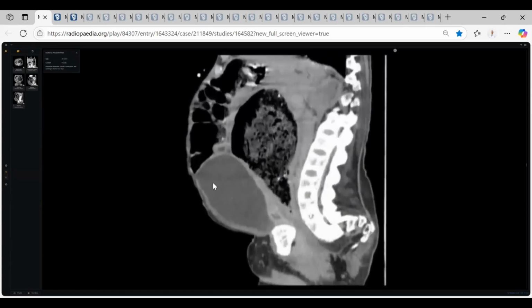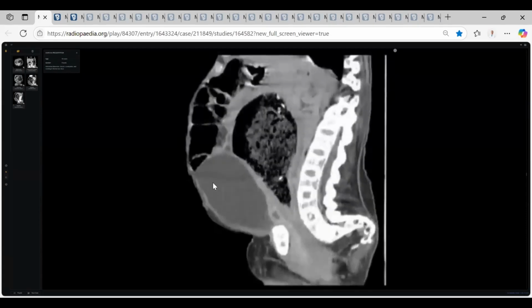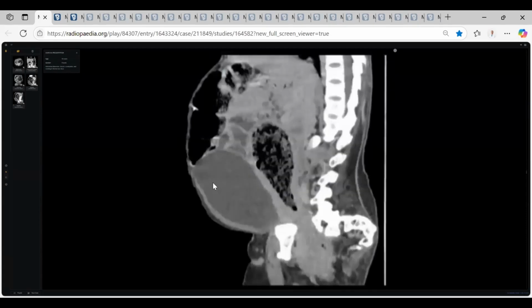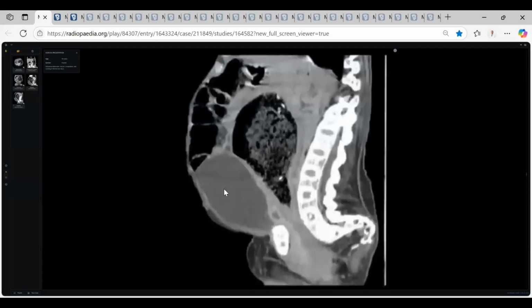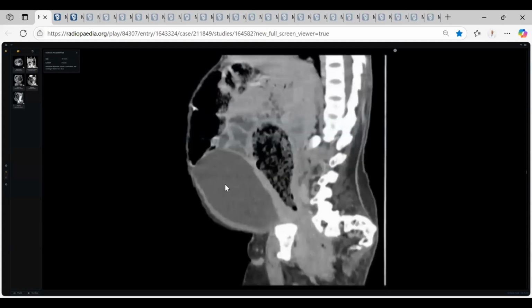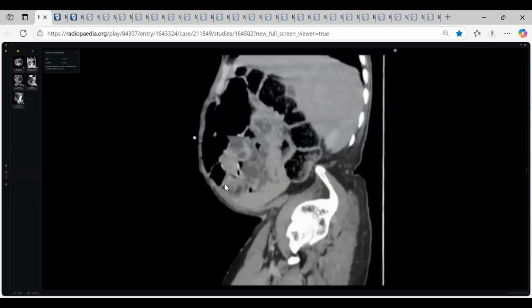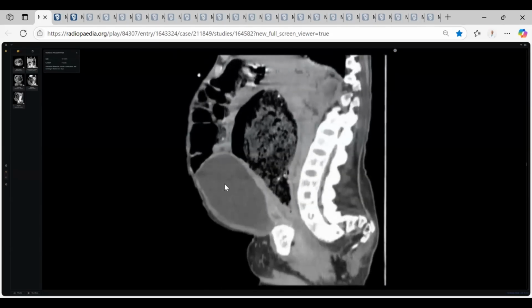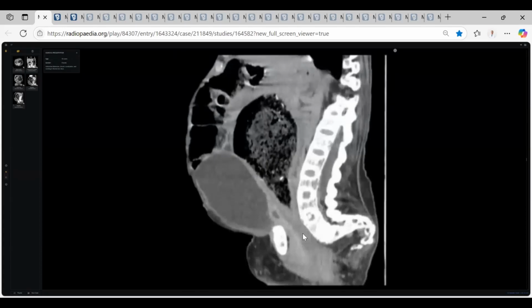By the way, this is chronic, for a long time. Maybe an ischemic stricture. What else? Or diverticular disease, but I can't see a diverticular stricture. What else? Or colon cancer, sigmoid cancer. Would you detect any of this? You give me a list, but is this list related to our case?